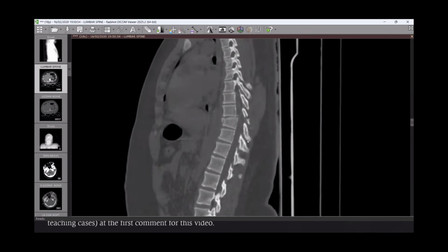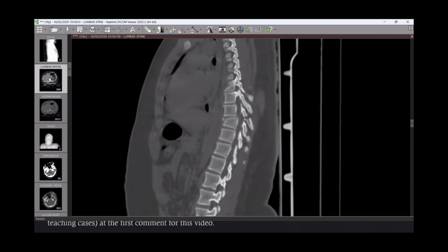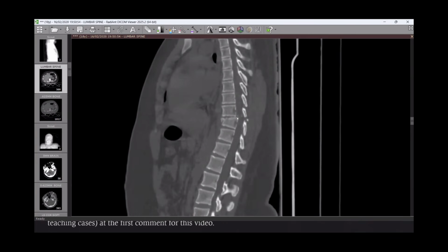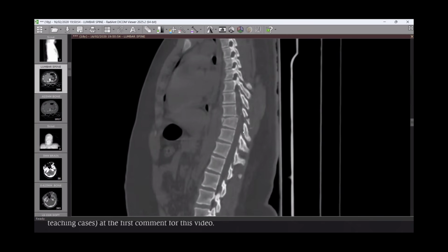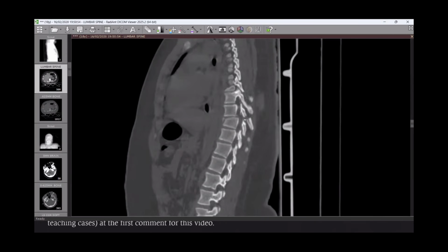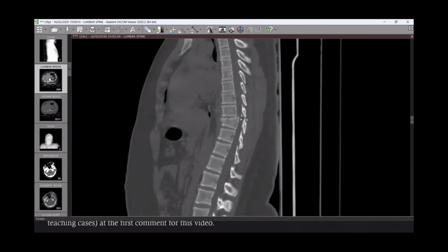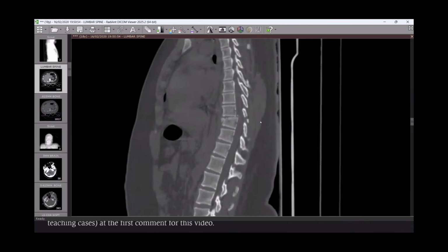We have compression of the vertebrae and the fracture along the superior vertebral plates going posterior to the posterior arch, and we have retropulsion of the posterior cortex inducing spinal canal stenosis, and this is simply a chance fracture or seat-belt fracture, because it is a fracture involving the posterior arch and the vertebrae, a mix between compression or flexion and distraction.